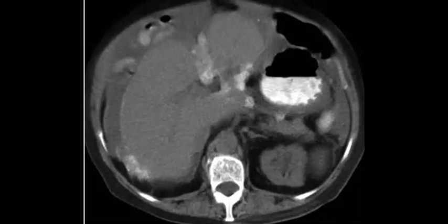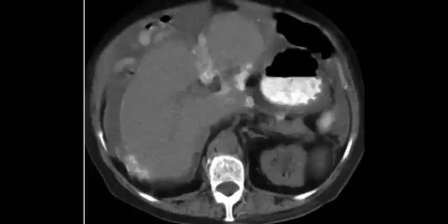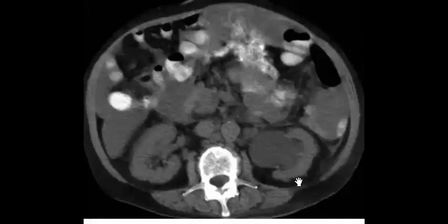The other differentials can be others, but with this case, because you already see the progression of this patient, you have the evidence that it is gastric and there are peritoneal deposits everywhere. So bilateral ovarian masses, and this patient comes to you after with this appearance. You need to check the left kidney, and maybe he will need ultrasound guided nephrostomy or nephrostomy in general.